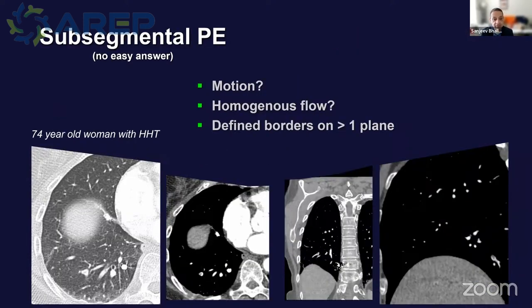Now, if you're not comfortable whether this is a real pulmonary embolism or not, as in this example, let me remind you, a good approach is to look at the lung windows to see if there's any motion.